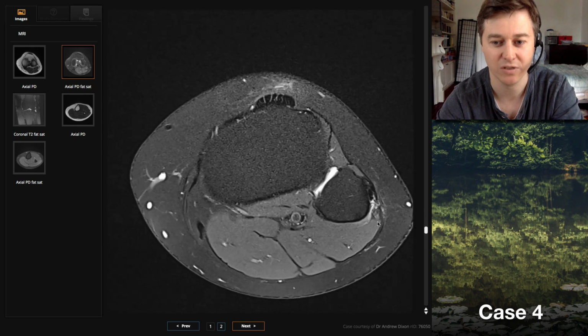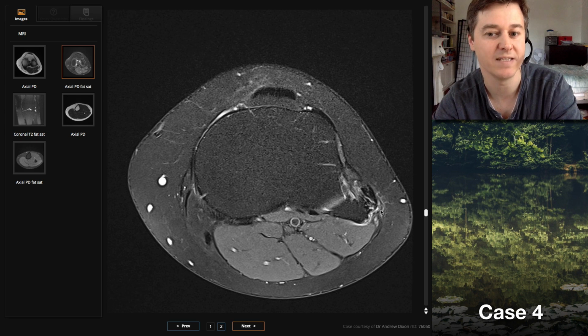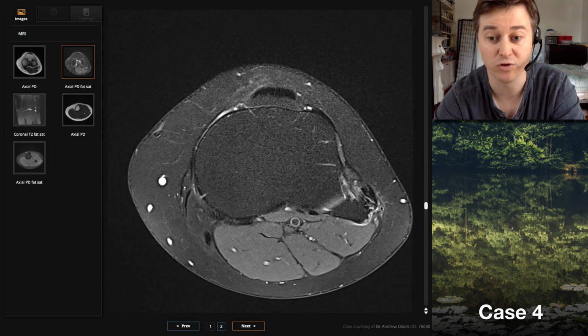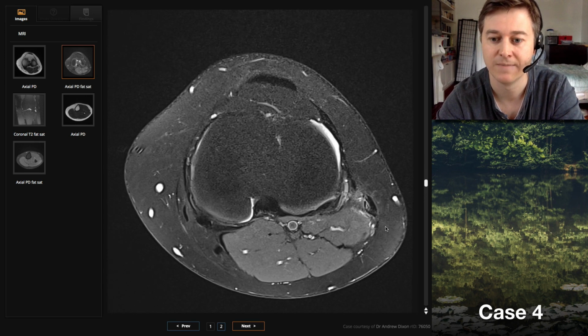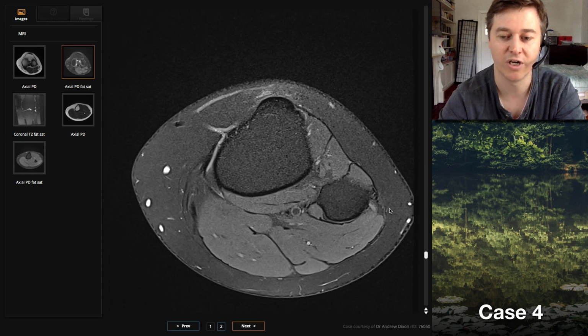And that's almost certainly the cause for their neuritis, secondary to localized inflammation from the biceps femoris tendinosis. There may have been local trauma to the area that's disrupted that tendon. It's hard to know. I can't see any contusion in the subcutaneous tissues, but there may have been a history of trauma.